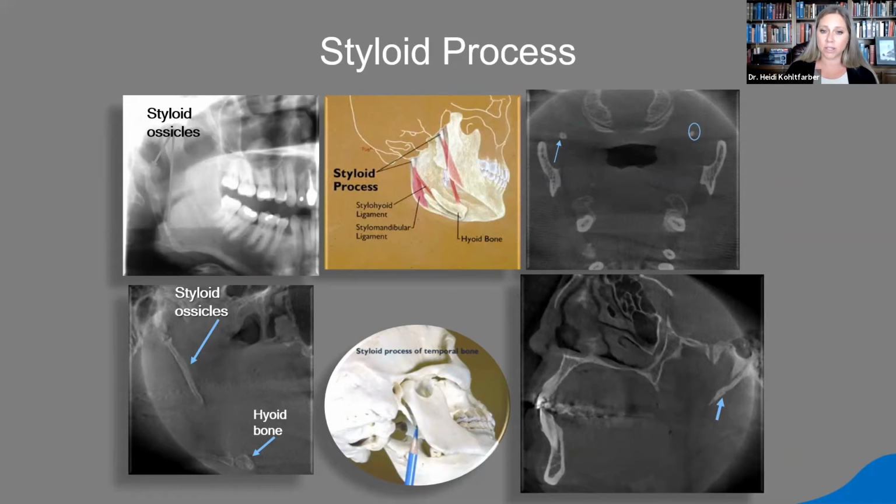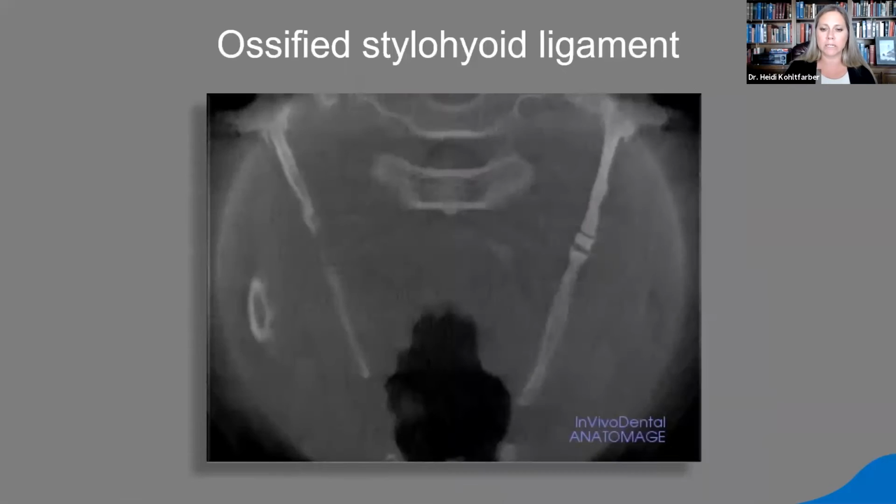Well, it's all in location, location, location. So our styloid process is going to be very high up in the neck, approximately at the C1, C2 level. When we're talking about a calcified carotid atheroma, it'll be at the C3, C4 level. So knowing what level you're at is very important.